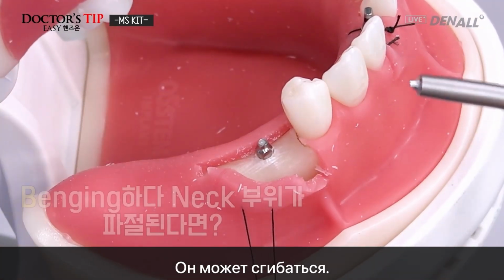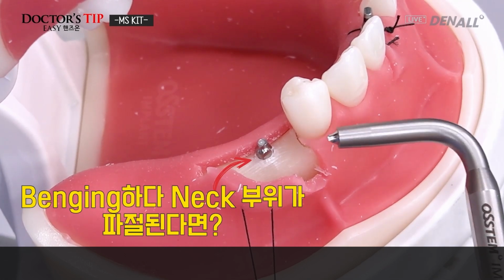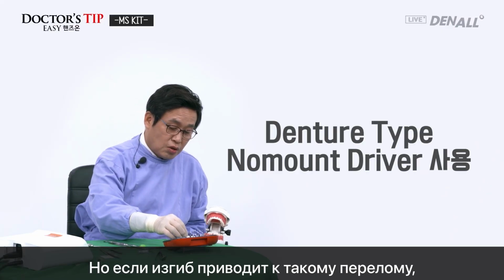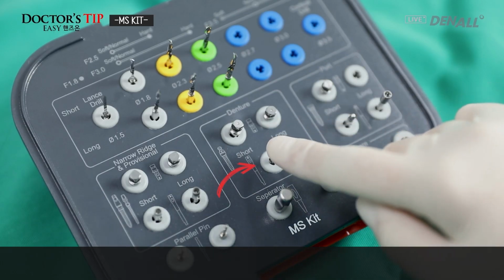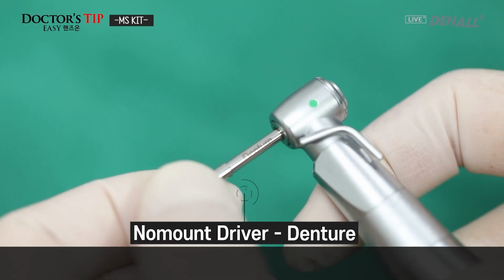But if bending results in such a fracture, then you have the denture type fixture driver, the no mount driver. For denture, you can use this.